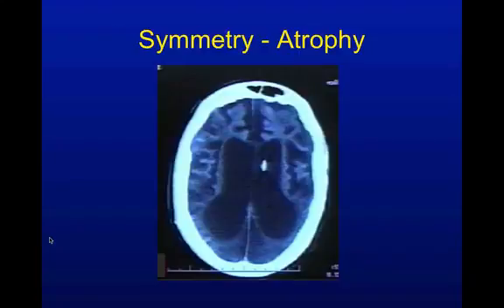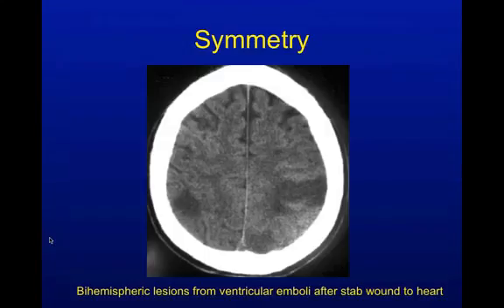Elderly patient, clearly. It's probably a ventricular shunt that he's got in place from long-standing hydrocephalus. It only did so much, but you're going to have to figure that out with the rest of the picture. What's going on here? Why did I get the CT scan? Am I concerned? Maybe it's for shunt malfunction and there's worsening hydrocephalus compared to a previous CT scan. Okay, symmetry. Well, the story's at the bottom. That kind of clues you into what you're looking for.